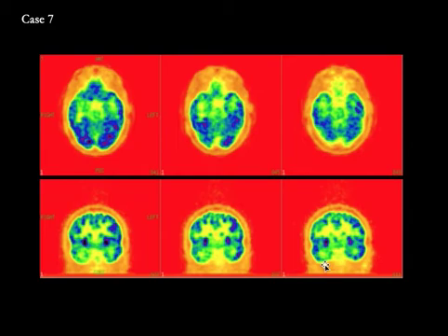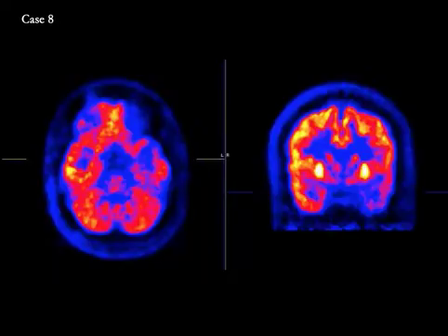During an ictal phase, when the patient is having a seizure, the seizure focus becomes more active compared to the contralateral side. So the interictal findings are compared with patient's history, EEG findings, and also, if possible, the ictal SPECT study. So here we have right temporal hypometabolism in an interictal phase consistent with presence of a seizure focus.